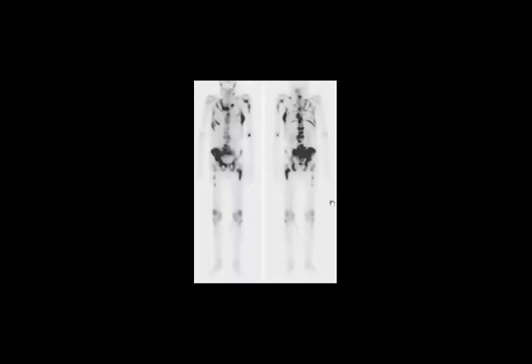So now you can confirm that there are, in the bone scan, multiple areas of increased uptake in the pelvic bones, spine, ribs, scapula. If you just look at the pelvis, you can put a differential of what? If you don't have any of those other lesions, if you just have this pelvis, you will put Paget, perfect, as a differential. But as you have everything in this case randomly distributed, it will be osteoblastic metastasis as a first differential diagnosis.